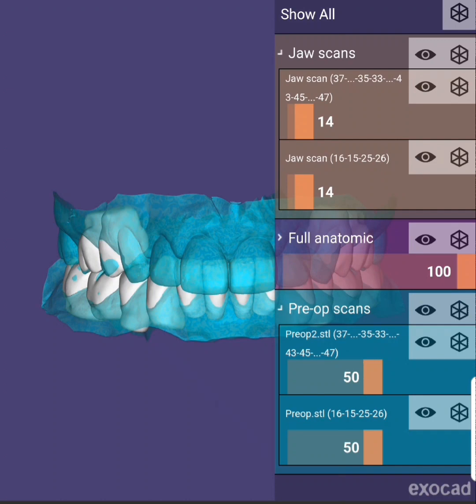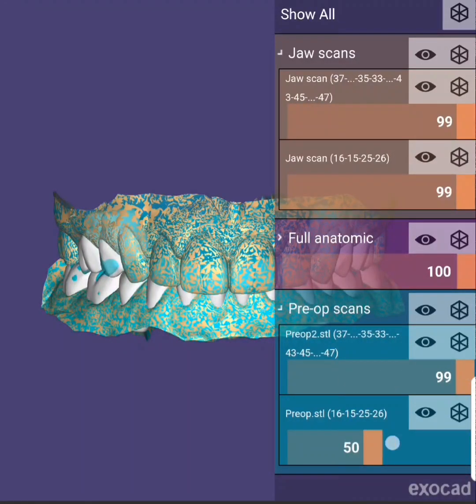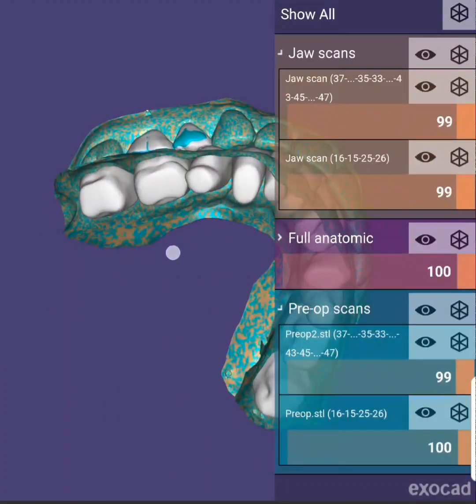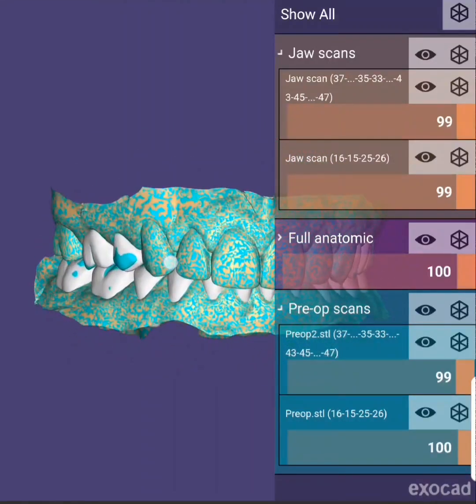And then also you can view how much he is using of that, and if any tooth is going to have further reduction. You can see right here. So he can see where he was originally, where the patient was before, and where we are taking the patient.